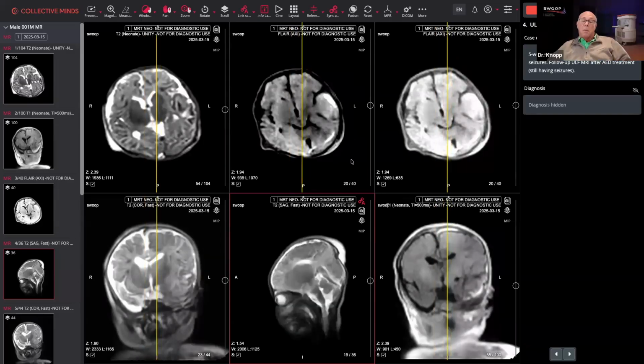Sure. So indications of swelling and mass effect tend to include some evidence of shift of normal structures in the brain parenchyma. What we've seen is most of our signal change is on the left, yet midline structures do not appear to be shifted. It's important from the sagittal imaging to look in the region of the foramen magnum, because significant increased supratentorial intracranial pressure may lead to what's called herniation, where the cerebellar tonsils extend through the foramen magnum and down, a very ominous sign, and I don't see evidence of that either.